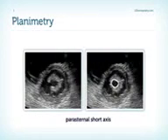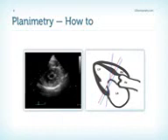The 2D image can also be used to perform planimetry. If possible, planimetry should always be performed. In reality, it's the only direct calculation of the mitral valve orifice area. However, there are a few pitfalls and a few things that you have to consider.